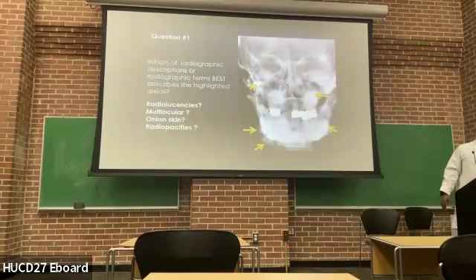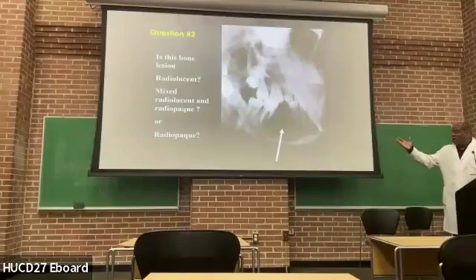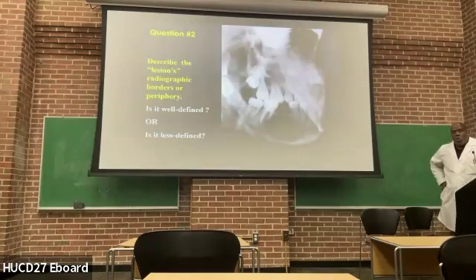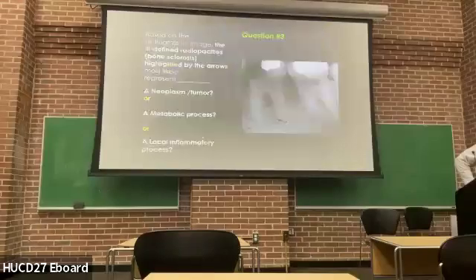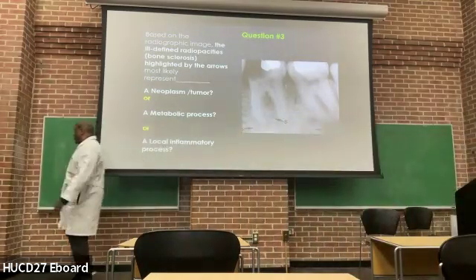Obviously, they are radiopacities. Yes? Obviously, this is a radiolucency, pretty much unilocular. It does have a somewhat regular border, but it's very low profile. Yes? Yes. For question one, is that a multilocular? No. No. Seems to stump a few people.